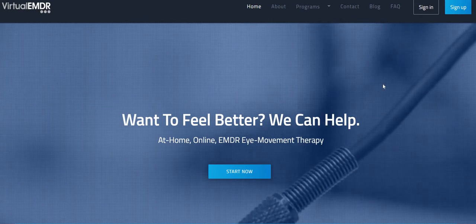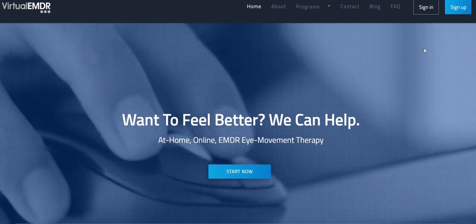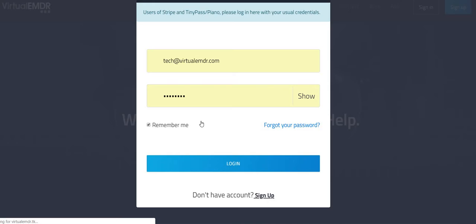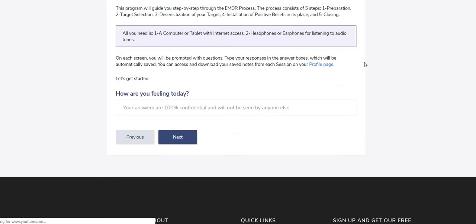We spoke yesterday. This short video is just going to run you through the upcoming version of our product. I'm going to sign in here real quick. It's similar to our old version. It's just more advanced. So start new session, and here we go.